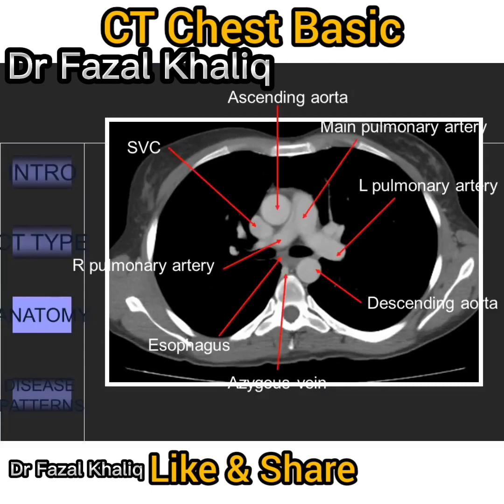Okay, think you've got them all? This is just one of the slices that you should know. But there is more anatomy that you should learn when looking at a chest CT. For more information, go to the anatomy teaching file, also found on this website. Staff always like to know what this tiny structure is. Don't be fooled by its size. It is mighty important.